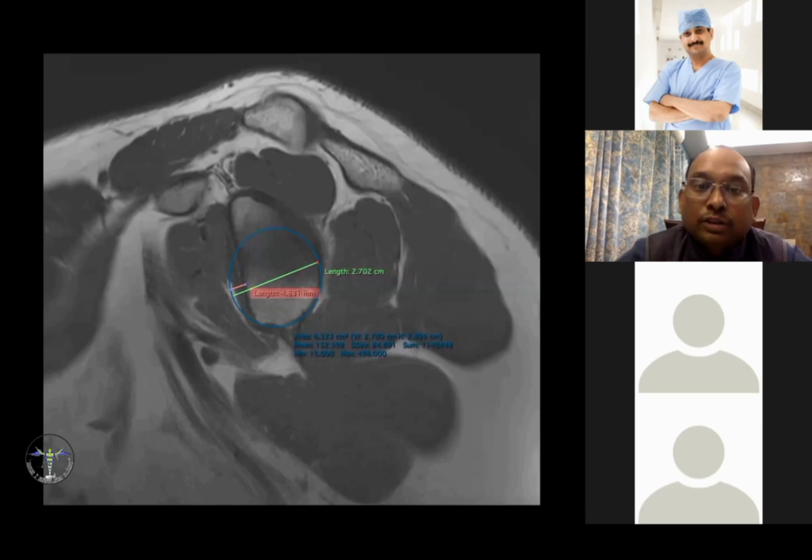No, yeah, we have to first do it in centimeters. 4.6, 27 minus 4, 22 point something. Okay. 0.46 divided by... Okay, so it is coming out to be 17%. The glenoid bone loss is 17%.